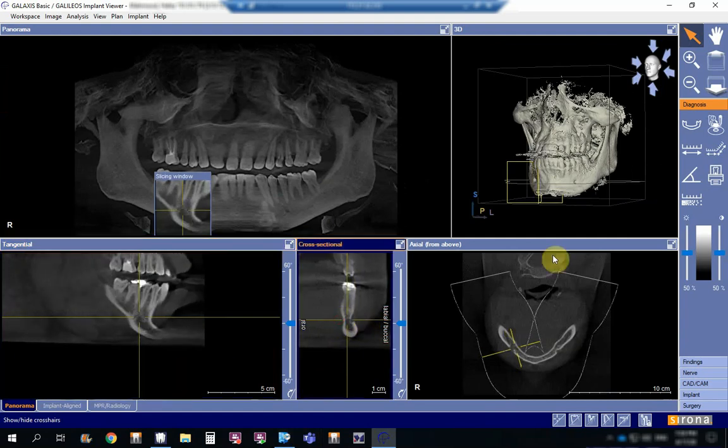The idea here, unlike the axial view, is that the sagittal views are more restricted, limited in their view. That's why I told you in the last video you better start with the axial view, because the axial view is the only view where you can go through the whole thickness of the images. Here you have to go layer or area by area.